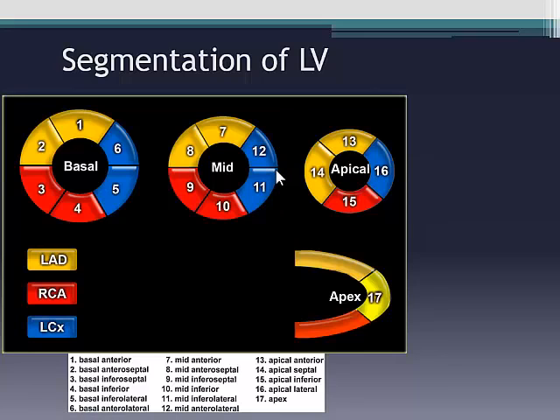Obviously, if you've got a CT, it's helpful because you can actually see the vessels that subtend that territory. But obviously, on MRI, when we report viability, we'll always report according to the 17-segment model, and you'll get some smart aleck going saying, oh, but it's an LAD territory infarct, and you said there's an infarct in the right coronary. Yeah, okay, well, that's life. It's because the anatomy varies.